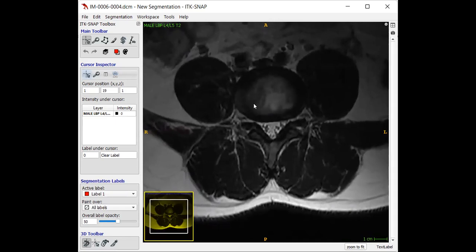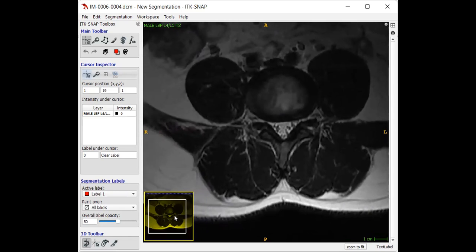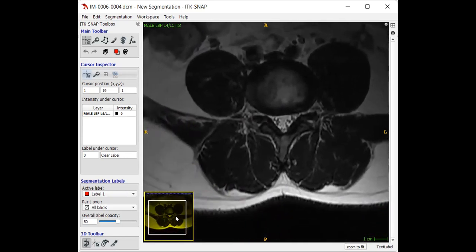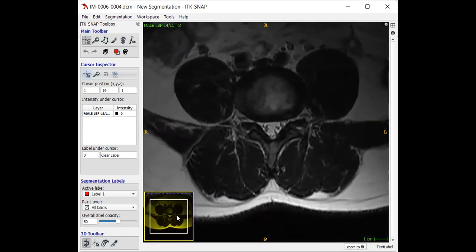In order to move an image around, you can either use this box here, you can click on it and then move accordingly, side to side, up and down, diagonally. If you have a mouse with one of the wheels in between the left and right buttons, you can also use that. When you click it down, then you can move the image around without having to use the box here.